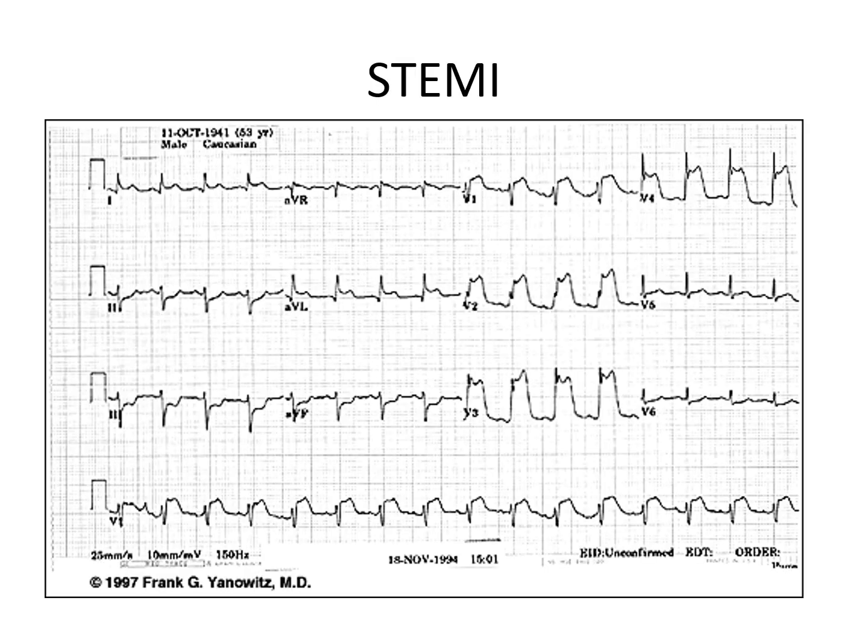So let's look at this person having a STEMI. If you look at the anterior leads, V1, V2, V3, up to V4, there is clear ST segment elevation. Well, what is the reciprocal territory to the anterior leads? It would be the posterior leads, which we don't routinely get unless we get a 15 lead ECG. So if we did a 15 lead, we can expect to see ST depressions there.